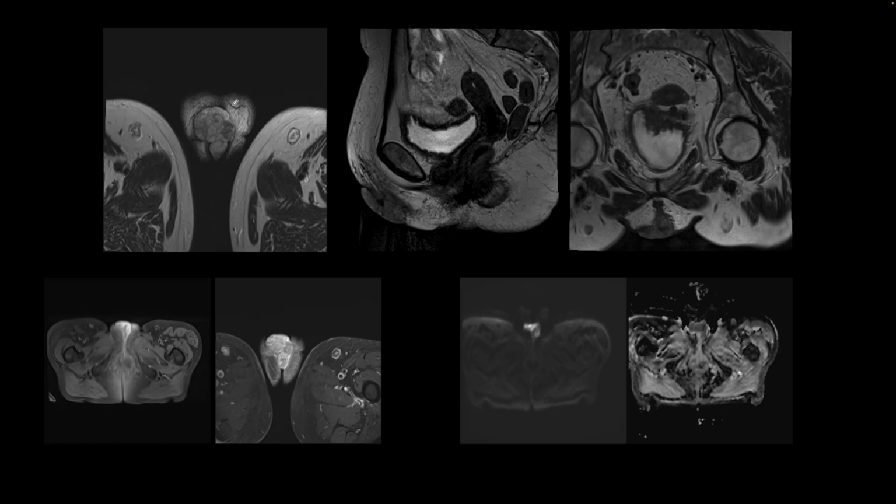On the MRI, here is the lobular T2 hyperintense mass, also seen right here, and here on the coronal T2 weighted images. These are all T2 weighted images on the top. And then on the bottom left, we have a T1 image. Remember that melanomas are intrinsically T1 bright, and that's what we see here.